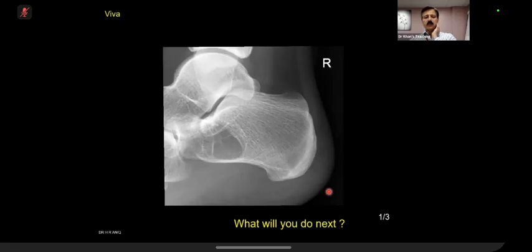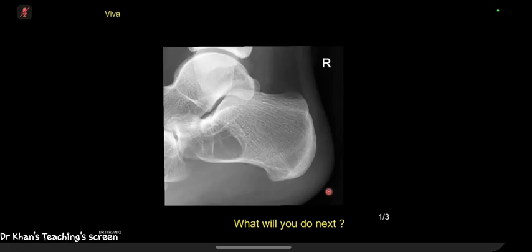Can you title this as a film? The lateral radiograph of a right calcaneus in a skeletally mature patient. There's a well-defined lytic lesion in the anterior part of the bone. I stop you because of time factor. What will you do next? So it looks benign. My primary differential is between a calcaneal lipoma or a simple bone cyst. If there are some small calcifications within, which favors lipoma, but if I wish to prove it, a CT could demonstrate the density of the lesion.